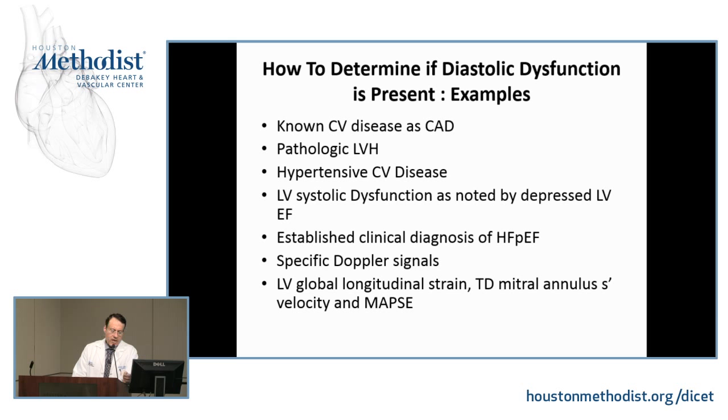One wants to be careful about an established diagnosis of HFpEF. Many times we get cases referred and the referring doctor says it's HFpEF. Want to be more careful and more critical for this group of individuals. Some Doppler signals are very useful by themselves. They will tell you there is disease, and we'll look at these.